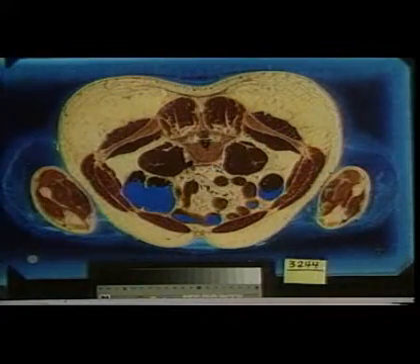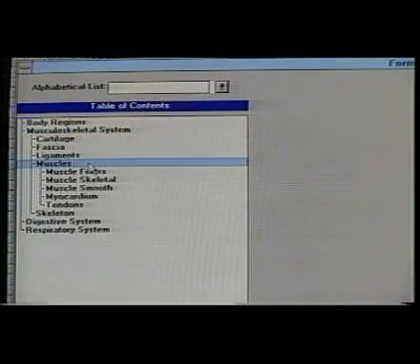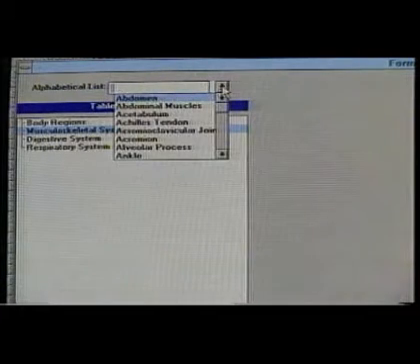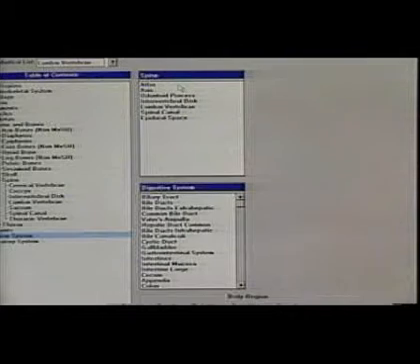This prototype integrates 3 search techniques: exploring the structure of a hierarchy, providing direct access by keywords, and filtering and linking by interrelationships.